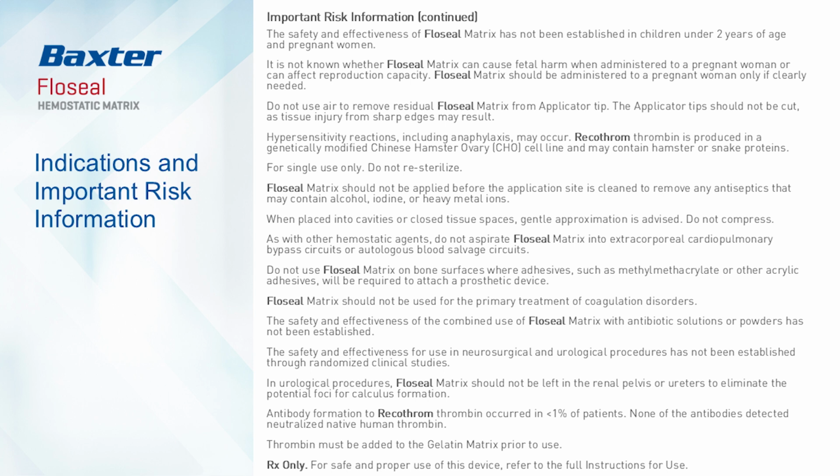When placed into cavities or closed tissue spaces, gentle approximation is advised. Do not compress. As with other hemostatic agents, do not aspirate FLOSEAL matrix into extracorporeal cardiopulmonary bypass circuits or autologous blood salvage circuits. Do not use FLOSEAL matrix on bone surfaces where adhesives, such as methyl methacrylate or other acrylic adhesives, will be required to attach a prosthetic device.